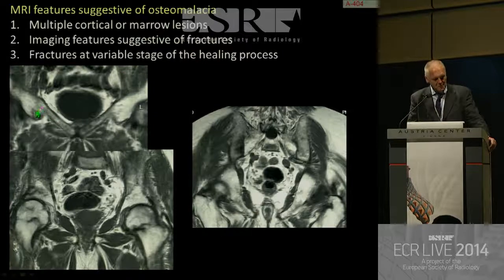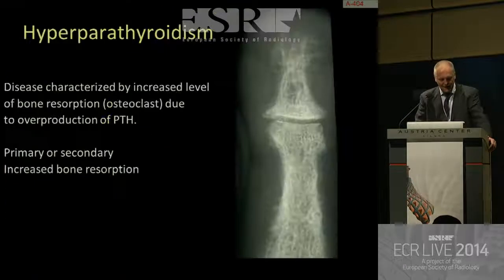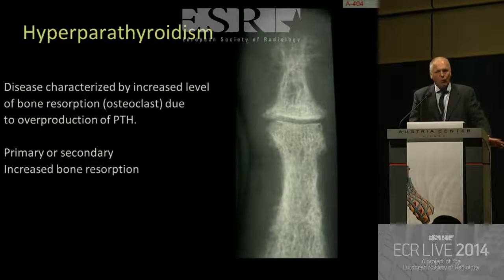And actually, the diagnostic MR feature that you will see in osteomalacia is this. You've got multiple fractures in many, many areas. But some of these look like chronic fractures. Others might be more recent with more edema. These patients do have multiple fractures that accumulate over time and last a long time because they do not heal correctly. One image, one diagnosis.